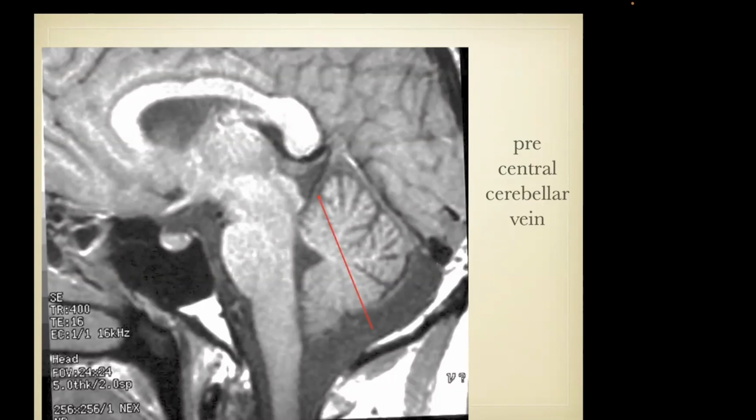Alex, where is the vein of Galen? Oh, this segment is called the vein of Galen. Yes, this segment where they all converge. So that's a good point, Viken. You'll hear that term often, but yes, that's the vein of Galen.